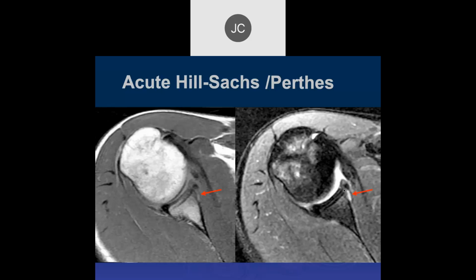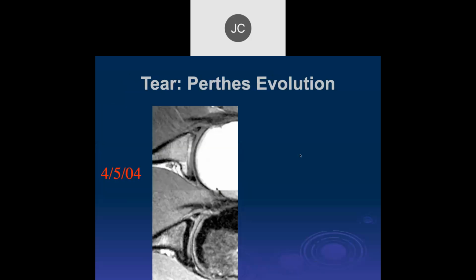This is pretty much the typical location where we see labral tears and anterior dislocations. So this is an anterior, and if you look farther, this tear went inferiorly as well. So this was more of an anterior and more inferior than usual dislocation, where we have a Bankart lesion, a soft tissue Bankart lesion here, and a superior Hill Sachs.